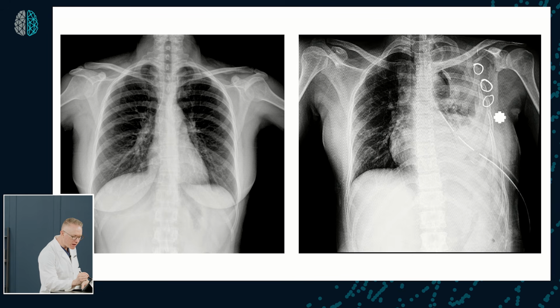Again, that's the importance of following them around. You also see something external going in with some markings here. That's a chest tube.